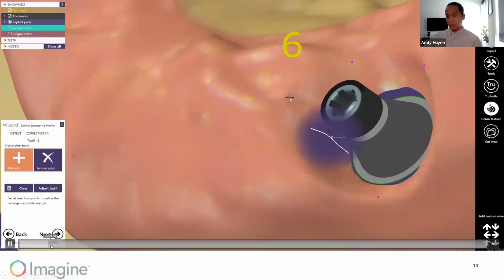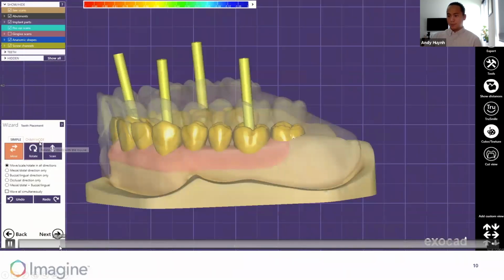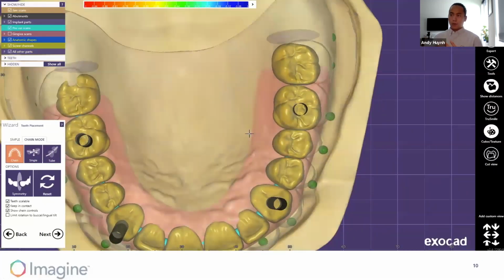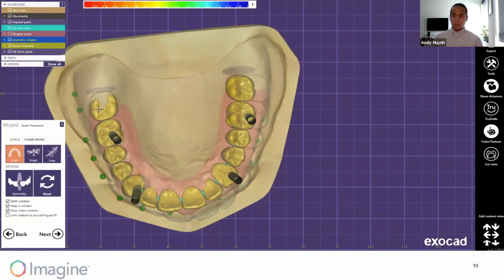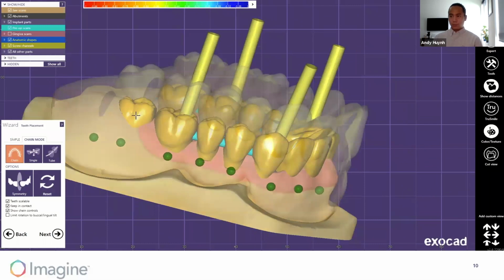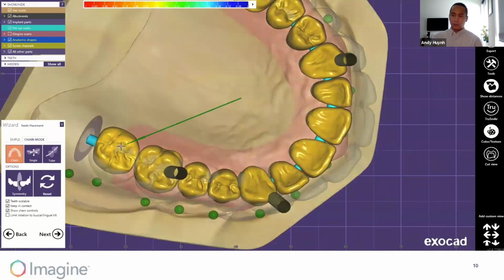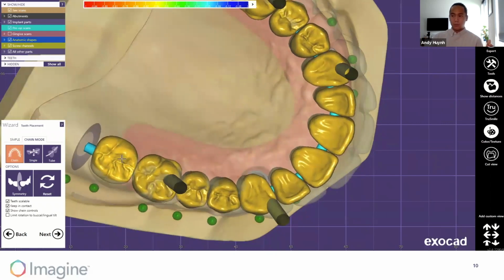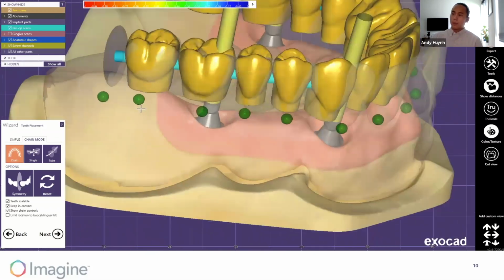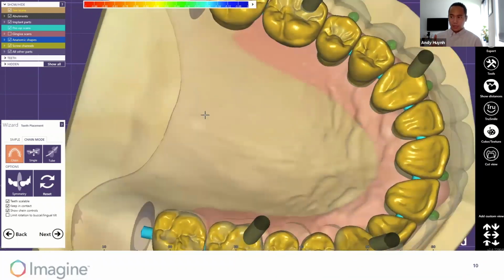For the demonstration, we're just going to skip ahead here and go right into tooth placement. So to expand on tooth placement methodology, as I mentioned before, I found it easiest to place the posteriors first and then lock them in. As you can see, you have 2 control spheres behind the furthest most tooth, and that's to lock the chain in position rather than that tooth specifically. And again, control is to rotate and shift is to scale.